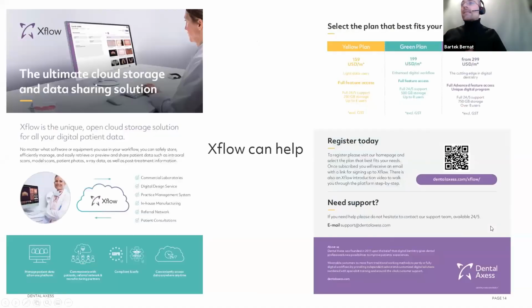So basically, I just need to cover one more thing. Obviously, if you're scanning the patient a lot, maybe you would like to store it somewhere. So again, I would like to recommend our service of the Xflow, that you can just hook to your system as yet another lab and send all of the stuff that you need to keep for later, that you need to archive. We have lots of plans, as you can see here in the top right corner, you can choose from, depending, of course, how much storage you want to have.